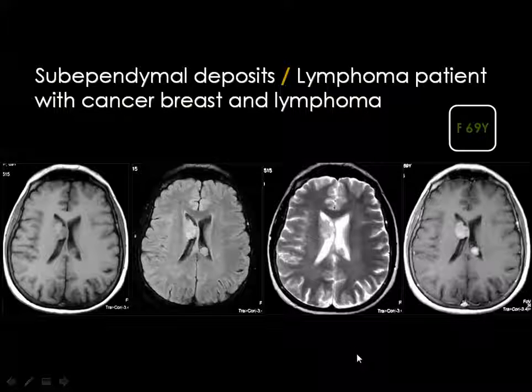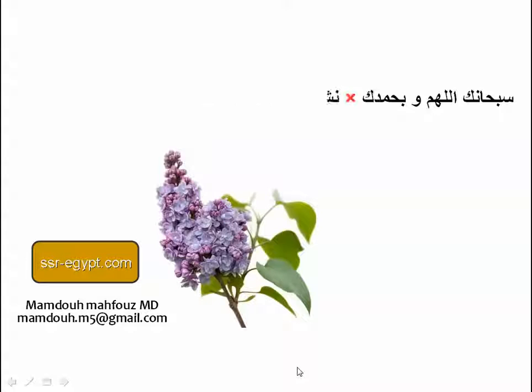Then what do you think of these lesions? Do they represent metastatic deposits or lymphomatous deposits around the ventricle? We do not know. Then you may go to the clinical picture. You may have the help of spectroscopy, for example, and I don't know actually the way of treatment of such lesions, whether it is directed to the breast cancer or lymphoma or both conditions.